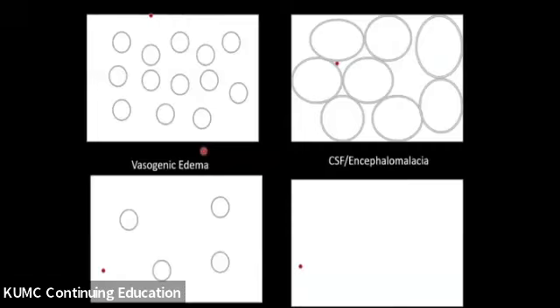When you have an acute infarct and the cells die and they have what's called cytotoxic or intracellular edema, and they swell, they restrict the proton diffusion and block off that extracellular interstitial fluid space as such. Very much like the deployment of airbags in a motor vehicle collision, restricting the movement of the passenger. Now, it won't stay like this forever.